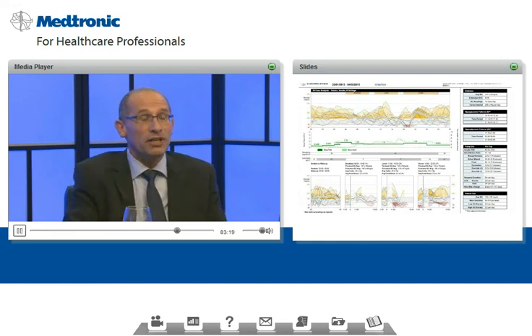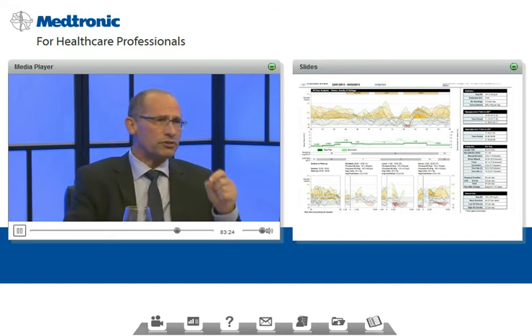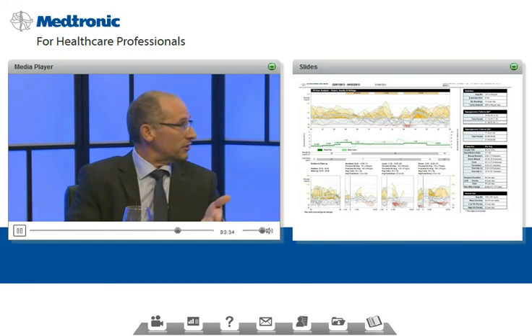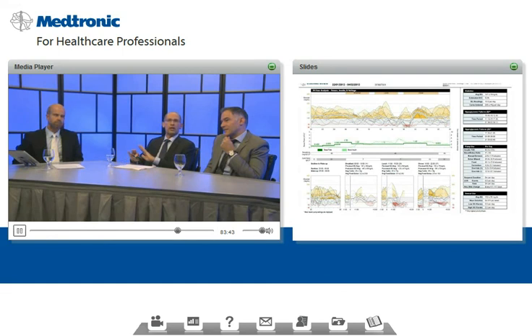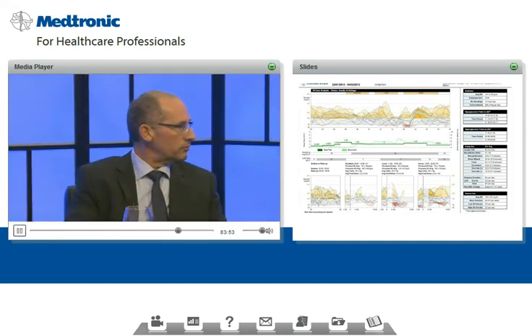Let's look at the hypoglycemia that the patient has between the hours of 4 to 6. You see there's a hypoglycemia there. And this is your question. You asked me whether it's a basal issue or a bolus insulin issue. And inadvertently, I have this download which hints to the issue: there's a slight increase in the active insulin right before the hypoglycemia. Again, not a 100% answer, but it makes you think that it is more of a bolus issue than a basal insulin issue. Yeah.